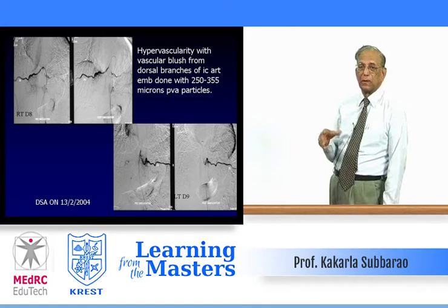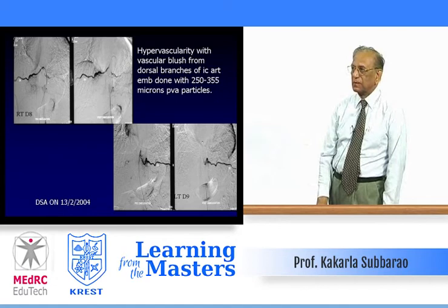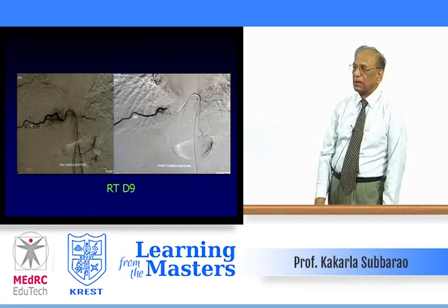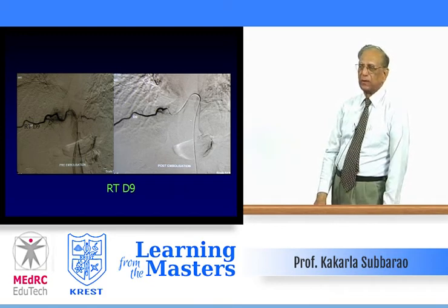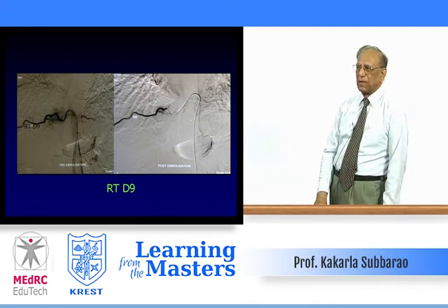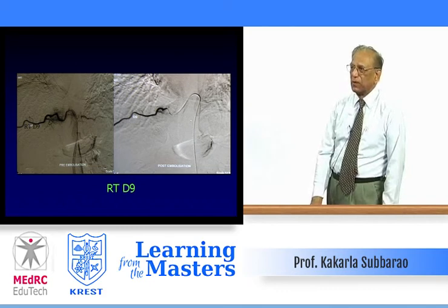Embolization was done thinking it is a hemangioma, or any vascular type of tumor. It's not an aneurysmal bone cyst, it's not expanding that much. With PVA particles, it's occluded. And not satisfied with this, they did a laminectomy, D9, with excision of the right pedicle, removal of the lesion with transpedicular screw fixation and a rod replacement to prevent further collapse. That's the picture.